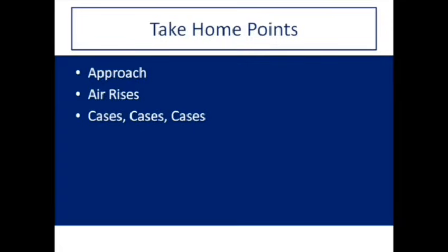There are a number of more subtle findings on abdominal x-ray that can be important in certain situations, such as pneumatosis, aka air in the bowel wall. But these more specific findings are well beyond the scope of this short video. Remember, this video taught you everything you need to know about abdominal x-rays for about 95 to 99% of the plain films you're going to see.